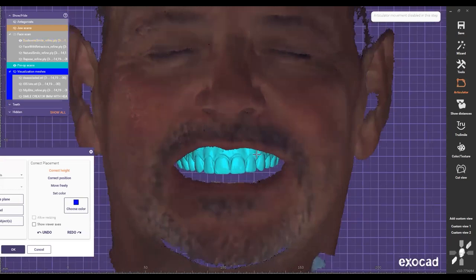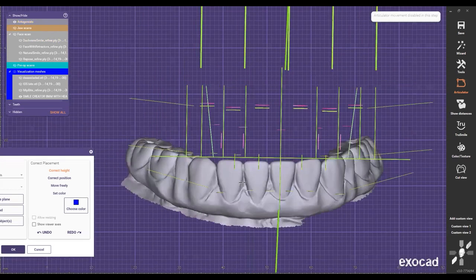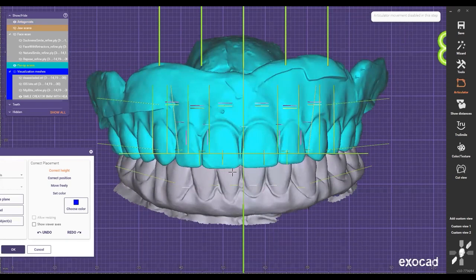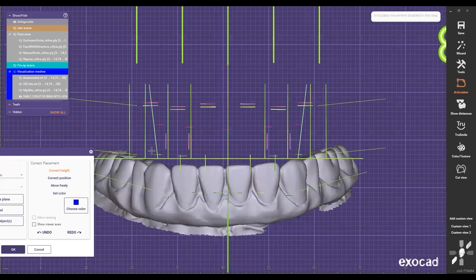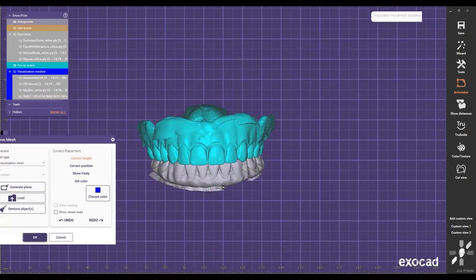So now I know where I'm gonna put my incisal edge position. It's gonna be right there. And then probably once I start the design, if I see that the lower is there and I'm gonna compromise my design, I'm just gonna try to make it a little longer. And those are the beautiful things that, once you start doing these cases, you understand how to troubleshoot it. You understand how to set it up properly. So in case my lowers are not in the ideal setup, how am I gonna fix this? That's one of the nice things that you learn when you're doing these cases. Because here I can see that I'm gonna have to bring the teeth lower, because I can imagine my setup right there. So now I'm gonna start the case. I know my incisal edge position and I just leave it there.